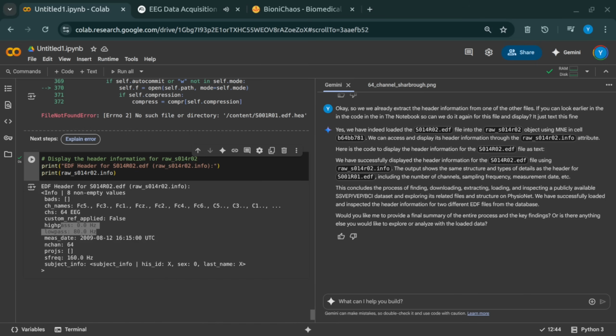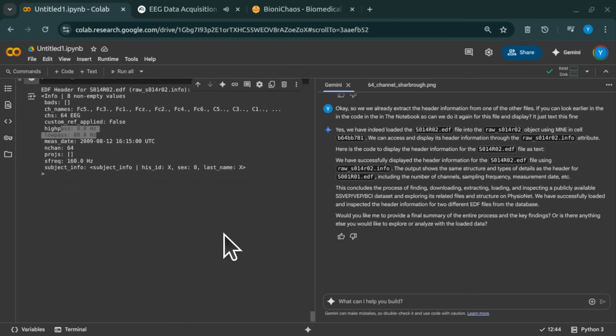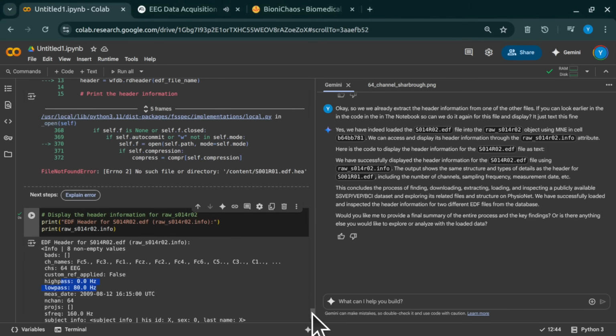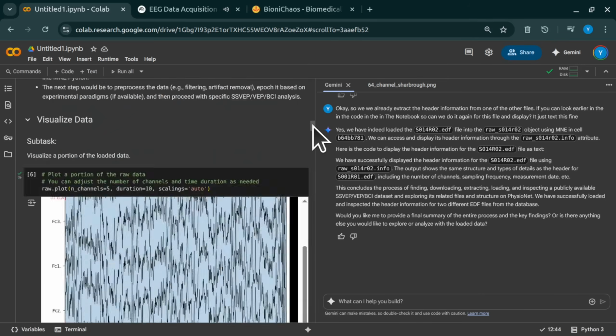Absolutely, and that's what we want to illuminate for you today. We'll walk through the kind of practical steps and, the common hurdles you hit when you acquire and first analyze this type of data. Think of it as maybe a shortcut to getting a handle on biomedical data. You'll see how to approach it, what questions pop up, and why tiny details like, say, file formats really matter a lot. Okay, so where did we actually start? The beginning of the trail.